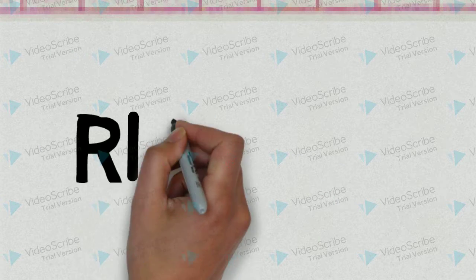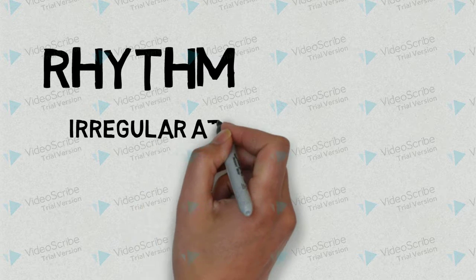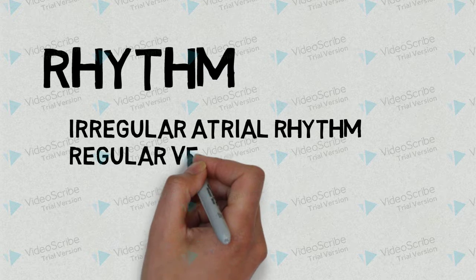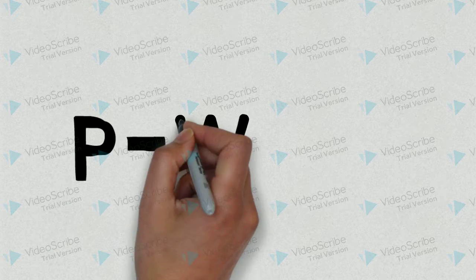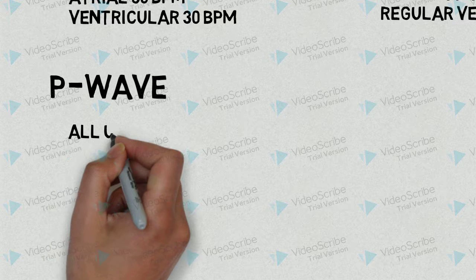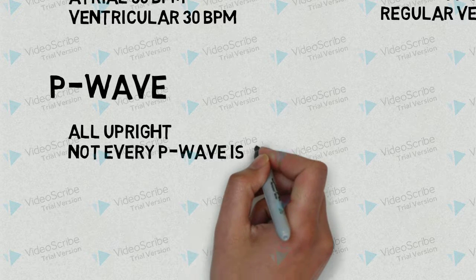Our second step in figuring this out is looking at our rhythm, where we have an irregular atrial rhythm, but we do have a regular ventricular rhythm. Then moving on to our third step, we look at our P waves, where we see all our P waves are upright, but not every P wave is followed by a QRS complex.